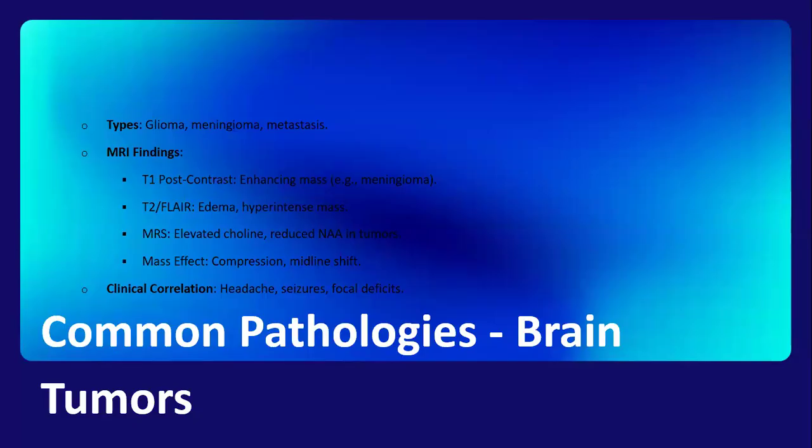So the aim of the exercise tonight is not to memorize the specific features for each common pathology in the brain, but to at least be able to describe: is this lesion hyperintense, hypointense? What sequence are we looking at? Is it a T1? Is it a T2? And why is it appearing in that particular way? And then you probably have maybe 3-4 differentials that you're looking at in that particular region. Next slide, please.